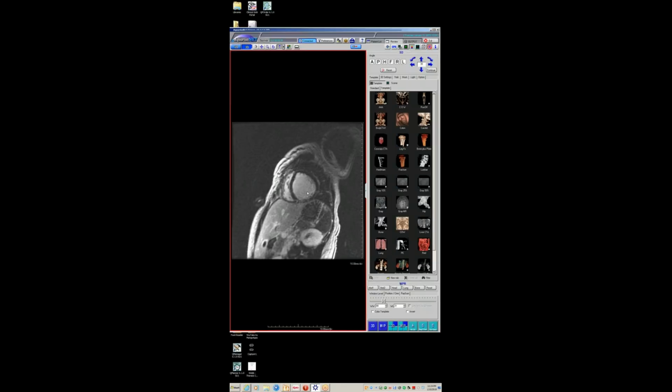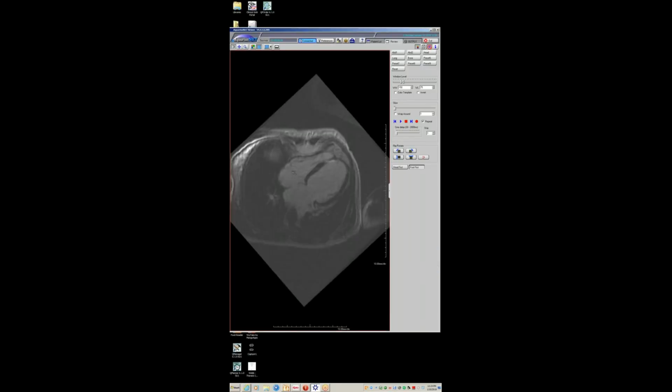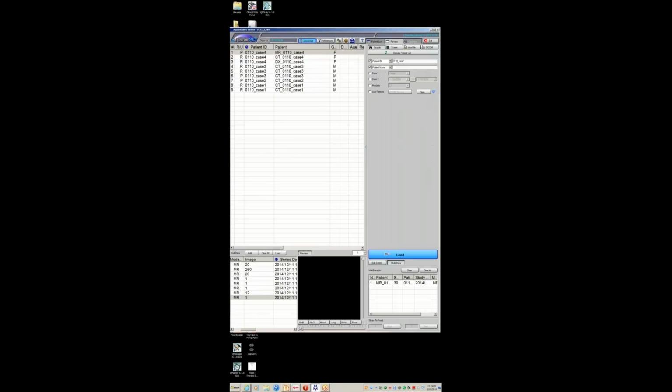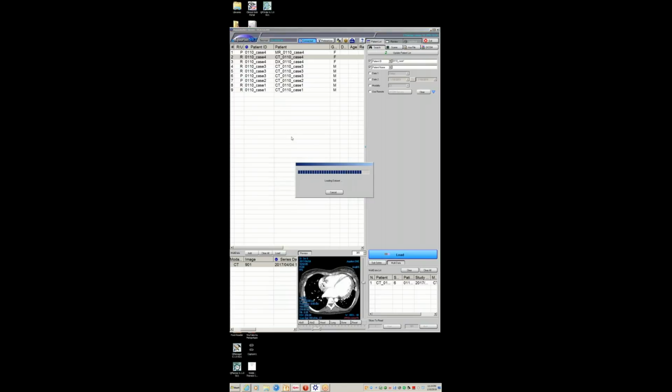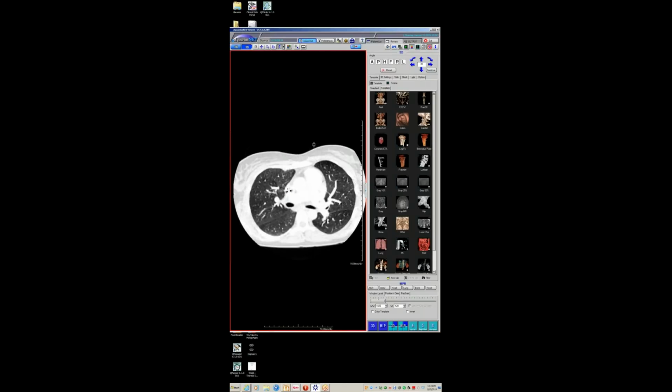I guess at some point she came in with a small troponin bump, and they did this, and presumably this was a vasospasm related infarct from methamphetamines, because they had no other explanation. She was doing meth all the time. So anyways, dilated cardiomyopathy with pulmonary hypertension and a presumed vasospasm related infarct in a very heavy meth user.